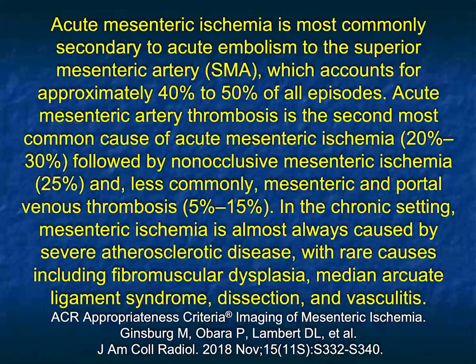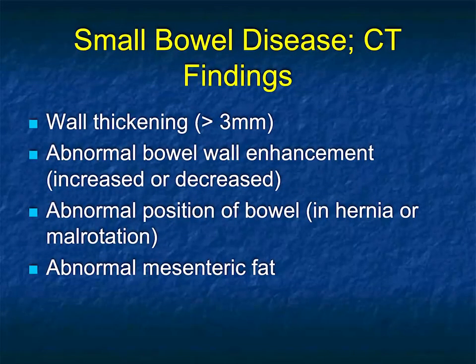But again, looking at the vessel patency becomes most critical. As we mentioned, when you want to look at the SMA and celiac, particularly proximally, where often the biggest problems are, the sagittal view is really ideal for being able to quantify the degree of stenosis based on the ability to see plaque or any other process that may be causing narrowing.